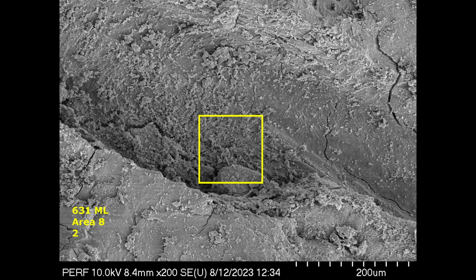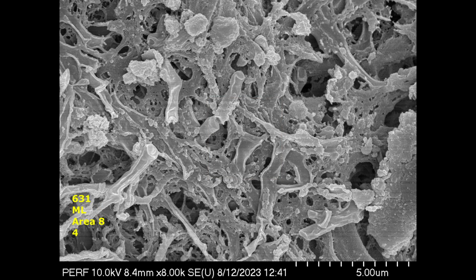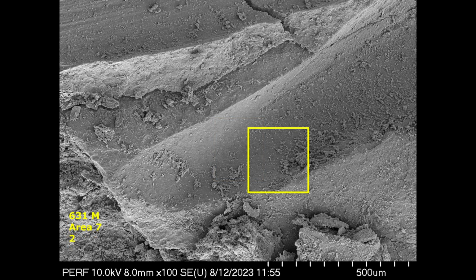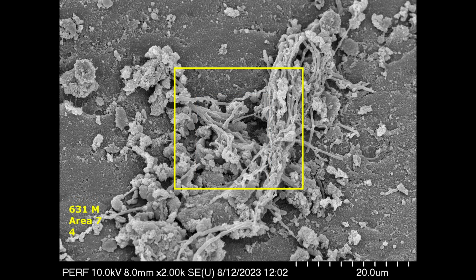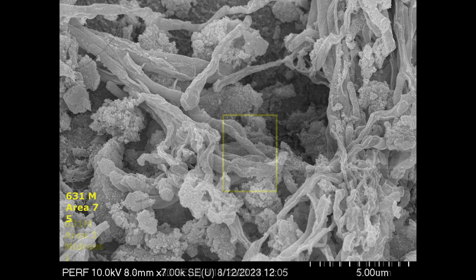In another area you look at, and when you go in very, very tightly, you can see that it's a fairly well entrenched biofilm. Doesn't look particularly healthy, but there are a lot of bacterial morphotypes. Then when you look at the mesiobuccal canal that looks like it had been instrumented to a larger size and instrumented very well, but when you go into the debris on the canal wall, you can still see a lot of bacterial morphotypes in the debris sitting on the canal wall.